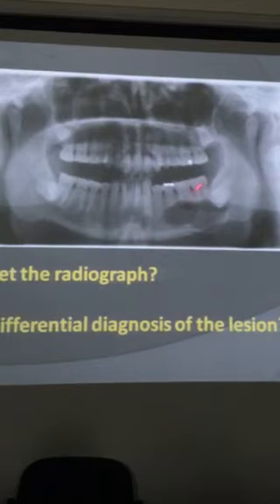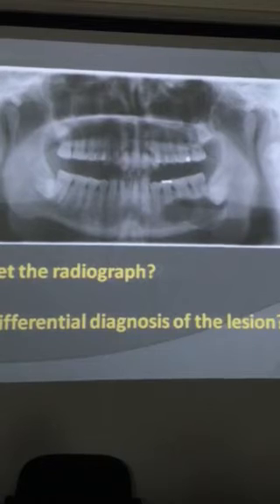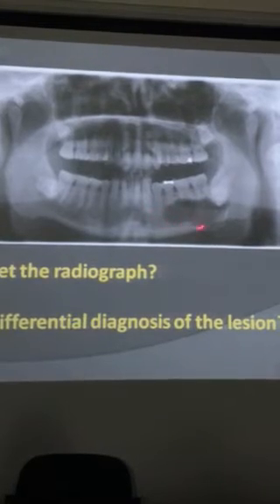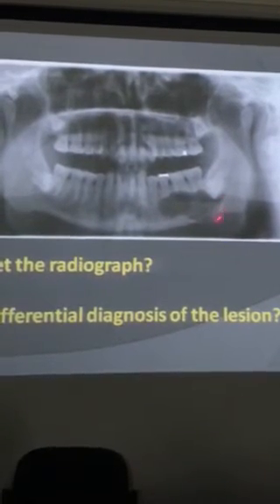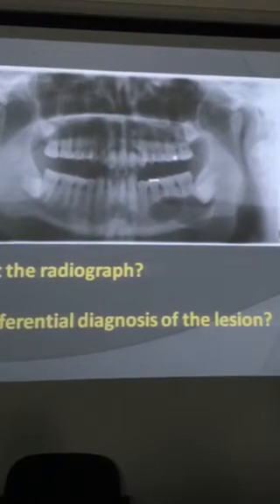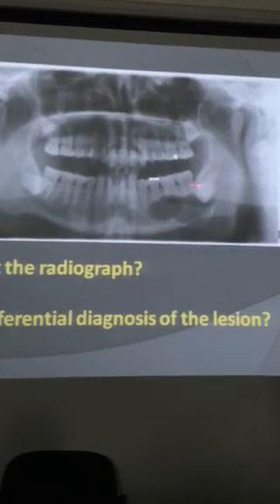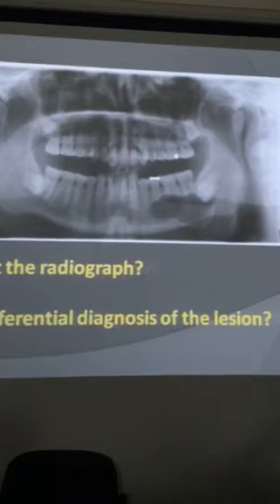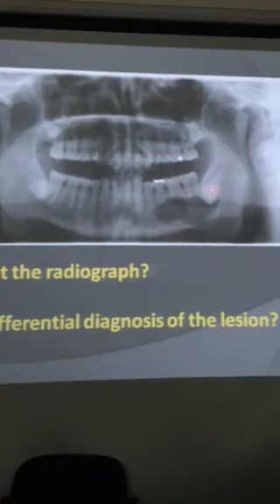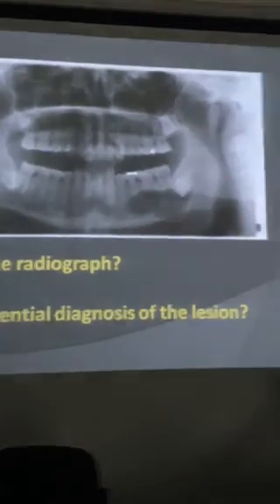Shape, irregular, oval. Okay. Then size. Around 3 centimeter, around 4 centimeter, no problem. Then density. Margin. Well defined, and in some areas you can see corticated. Effect is root resorption and expansion. It's not fracture, it is expansion. So two effects here: resorption and expansion. Clear? Extension. Anterior posteriorly starting from the first premolar till the third molar. Superior inferiorly starting from the periapical of molar teeth till the lower border of the mandible.